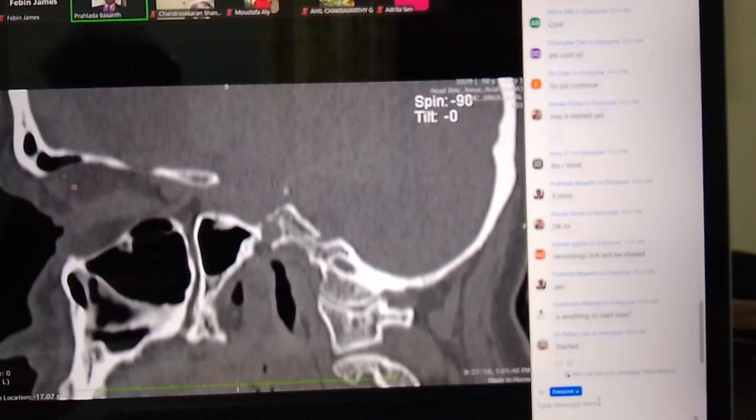Okay, and this is the pterygoid pneumatization, and this is the fossa of Rosenmuller, and this is the Eustachian tube opening. Okay, this is orbital cavity and the frontal sinus. This is the maxillary sinus, medial wall of the maxillary sinus. Maybe this may be the attachment of the inferior turbinate. This may be attachment of the superior turbinate. This may be lacrimal canal.